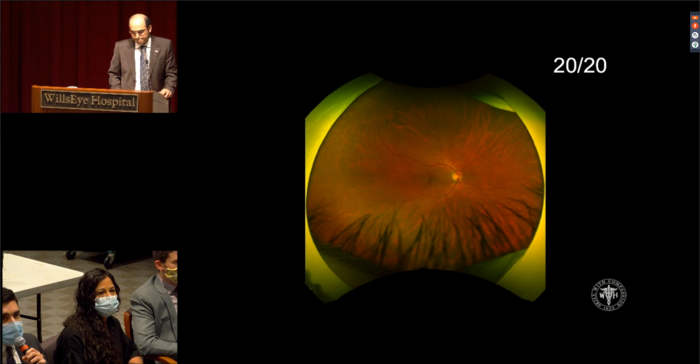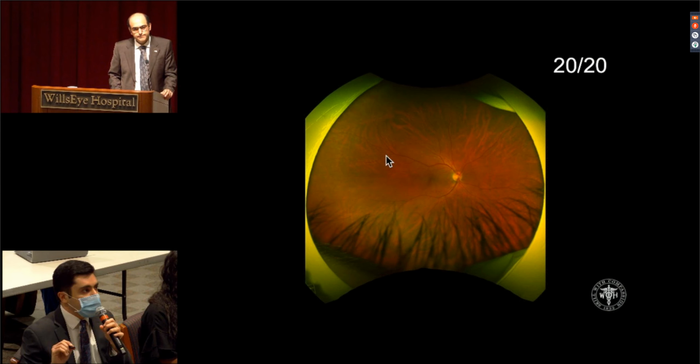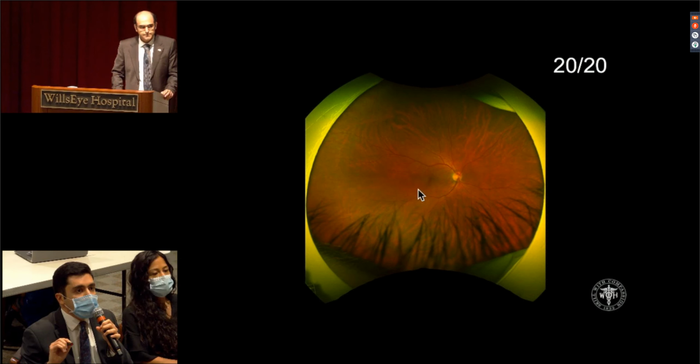Happy to. So we have a pseudocolor wide field fundus photo of the right eye. Central acuity is intact. Media grossly appears clear. It sounds like there may have been some trace cells. Looking at the disc itself, the nasal aspect appears slightly obscured. The temporal part looks okay. No hemorrhages there, and the retinal vasculature appeared to be of normal contour and caliber extending to the visualized periphery as far as I can see here. No lesions in the macula.